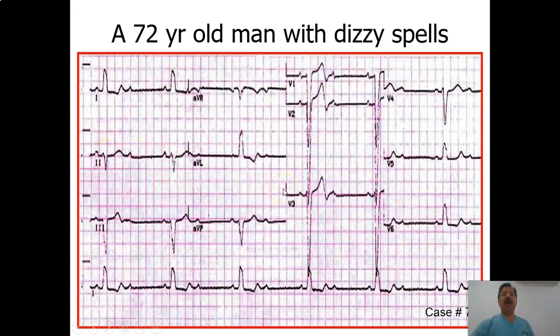Hypertrophy: don't comment on hypertrophy in the presence of wide QRS complexes like in this ECG, so we'll omit this step. And next is the bundle branch block. There are obviously wide QRS complexes, in lead V1 negative, and positive QRS complexes with a notch in V5 and V6. So this is your left bundle branch block. And the ST segment, the 6th step: there is no ST segment elevation or depression, no T wave inversion. So the issue is mainly the rhythm.